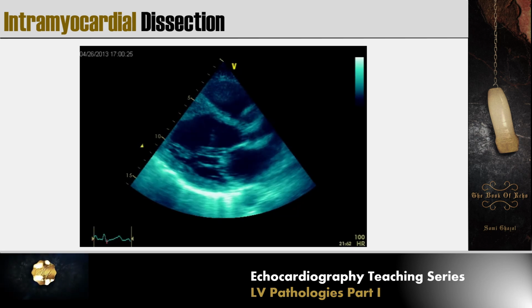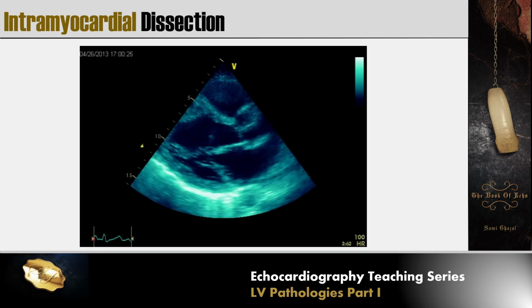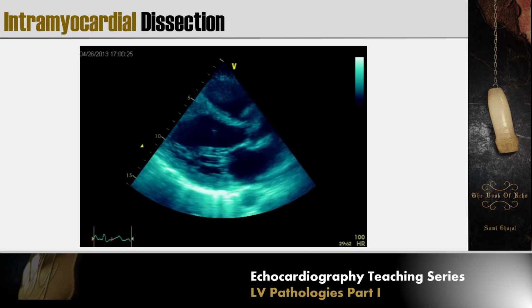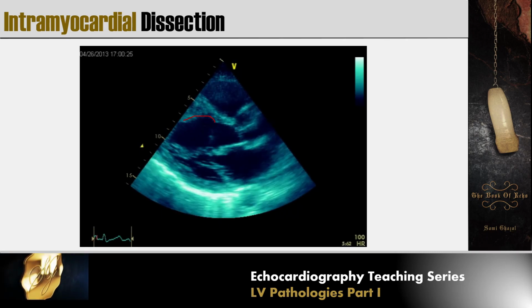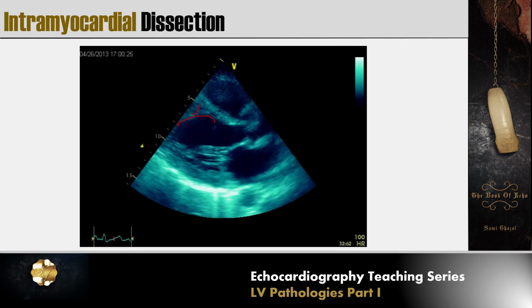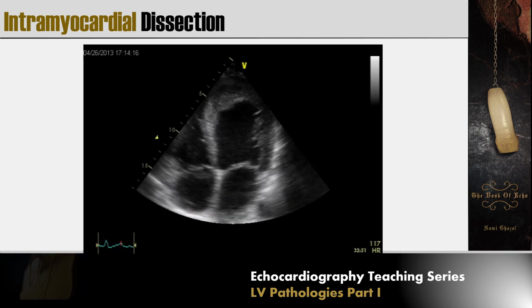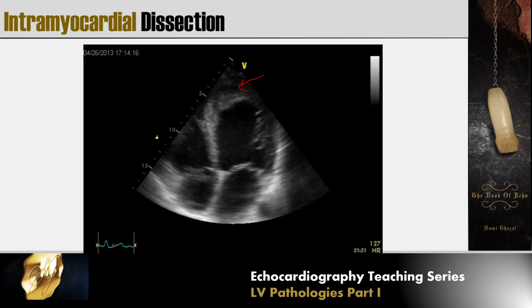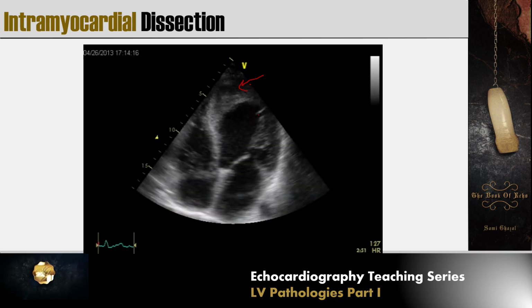Now, while maintaining the integrity of the epicardium, you can still see here the epicardium and endocardium. You can see the integrity is maintained, but there is something here. Now, we will see this in the coming videos. This is an example. You might think, okay, this is a thrombus here, but a careful look will show you that, okay, this is the endocardium that continues here.